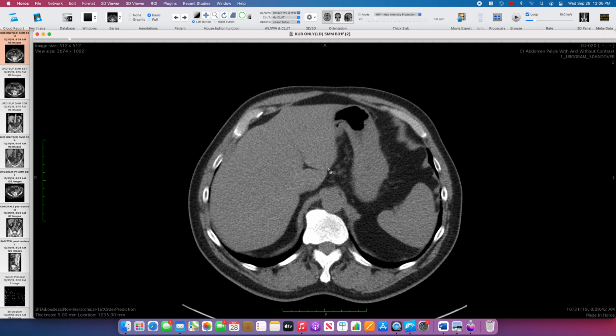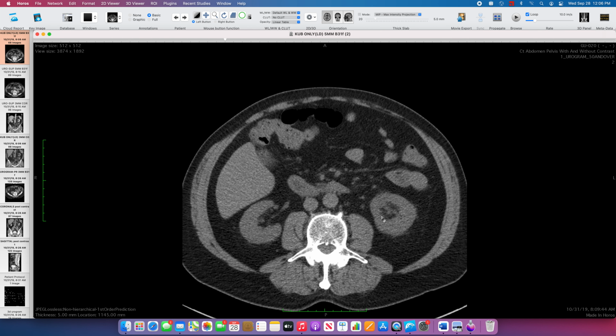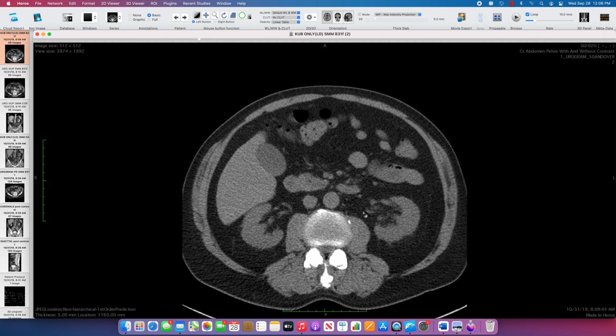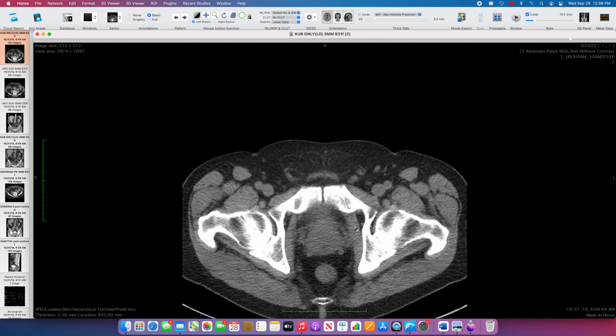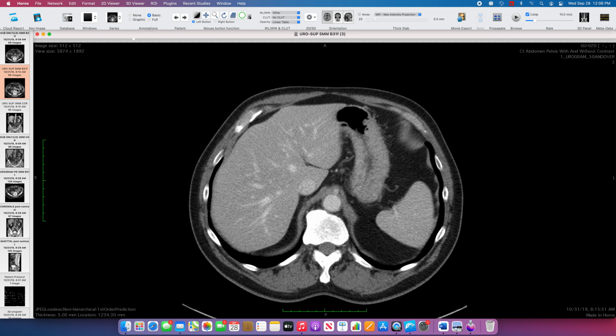So I'd say the non-contrast is most helpful to look for stones. We'd be looking for any renal stones or anything here in the collecting systems, possibly a tiny stone here on the right in the upper pole, looking for any stones along the ureters or within the bladder, anything to account for the patient's hematuria, which is typically the indication for this study.